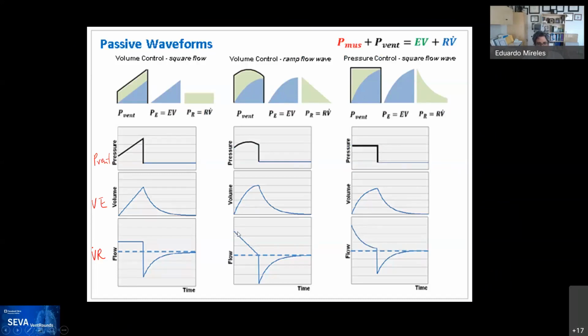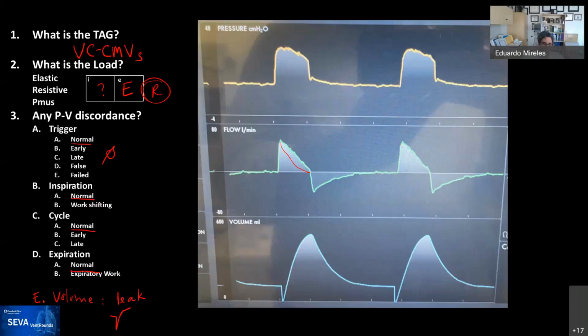And then you can see over here a flow decay. Now, I don't know why they haven't done this on the ventilator, and Rob perhaps has the answer, but they could potentially, if they wanted, have an exponential decay on the flow waveform being controlled by the machine, but they have not chosen to do that. They just did it linear, and I don't think there's a good reason for that, but it's an interesting item. It would really sabotage us, then it would be hard to know exactly what you're reading, but this is a good marker of why this is volume control. Rob, comments?